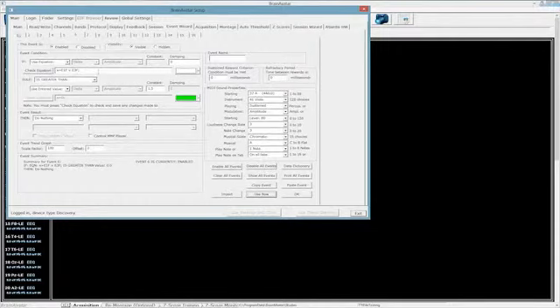So if the event condition for event 1 is true, which is basically if this is less than my upper threshold, and if event 3 is true, which is if it is greater than my lower threshold, both of those must be true, which means it must be squished right into the middle of that. If they are both true, then I'm going to get a value of 2.